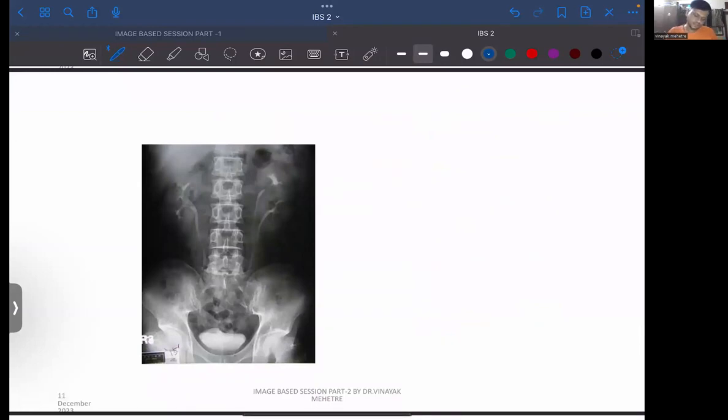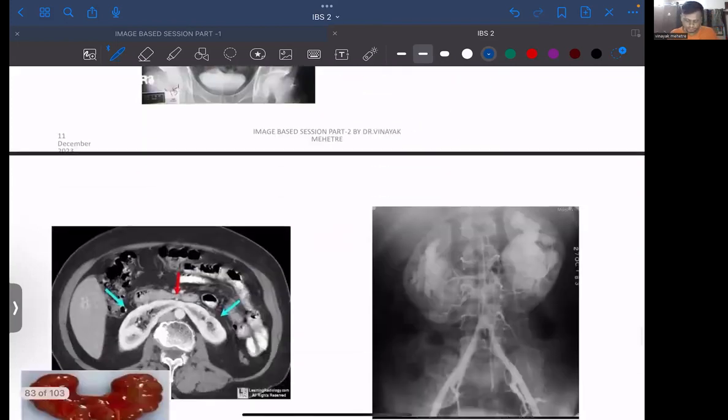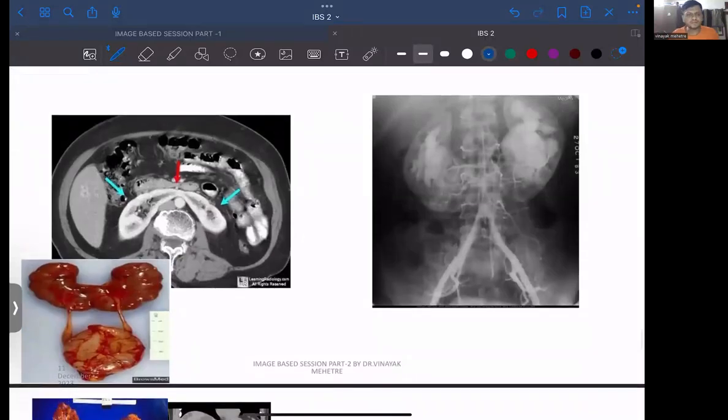Take a look over here. It is one ureter but now we have two ureter. सो इसे क्या बोलेंगे हम? One ureter is extra, ectopic ureter. It is called as ectopic ureter. Examiner's favorite. It is called as, what we will call it?